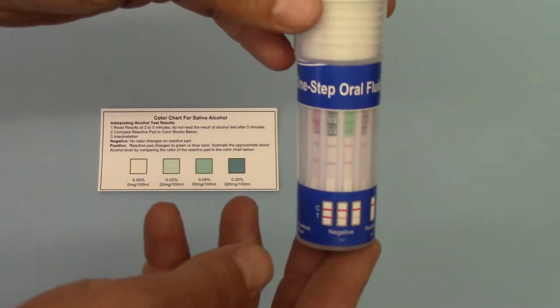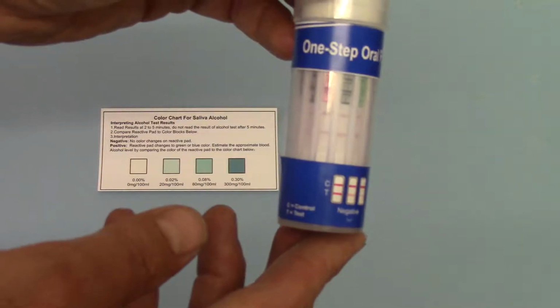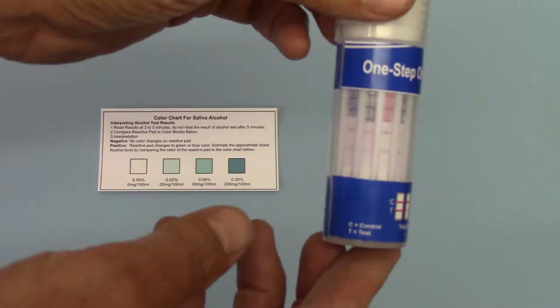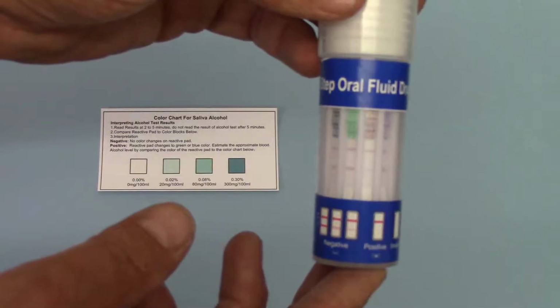The very important thing in terms of your interpretation for the results is it does not matter how thin or faint the test line is. If it's clearly discernible in the presence of a control line at the read time, you must interpret that as a clear negative drug screen.